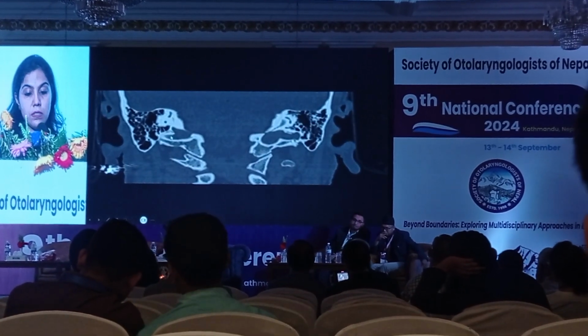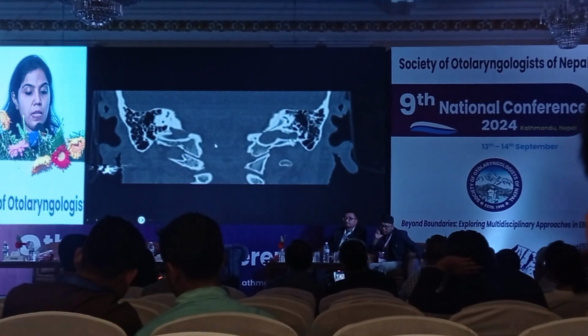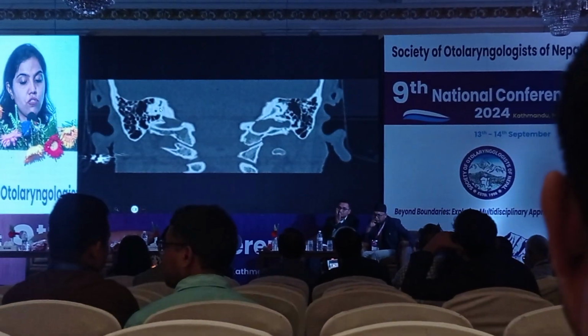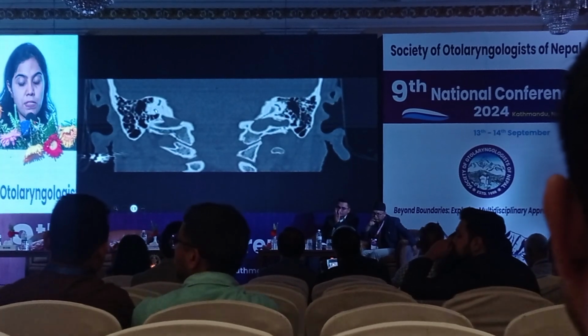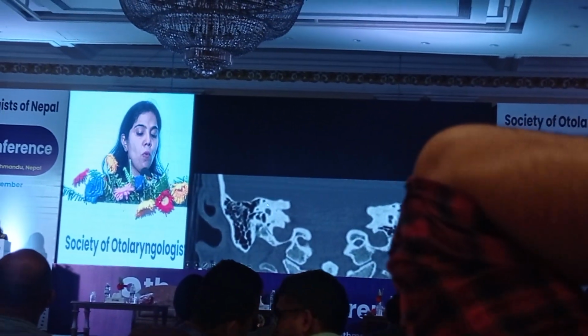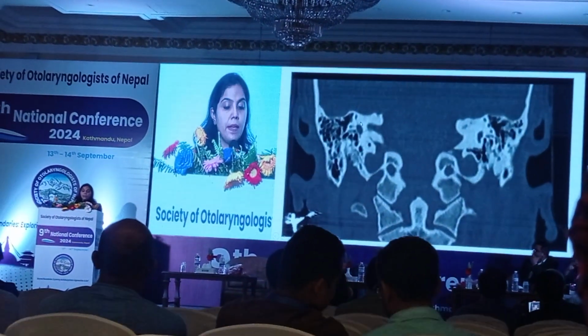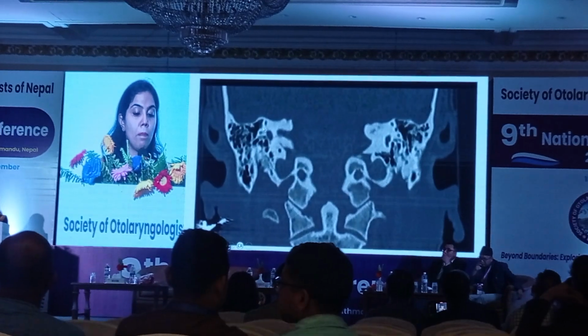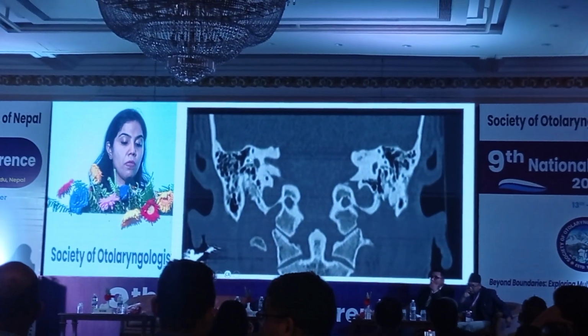Now, again I am coming from deep inside to out. This is again the appearance of the two dots, the first structure. These are the openings of my semicircular canals. As I go further, the openings get wider, and here I can see the appearance of the vestibule with the proper appearance of canals on the coronal section.